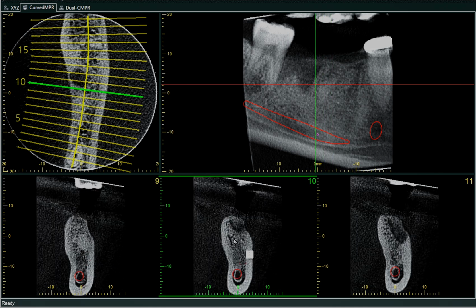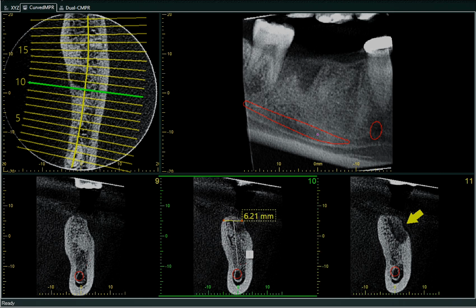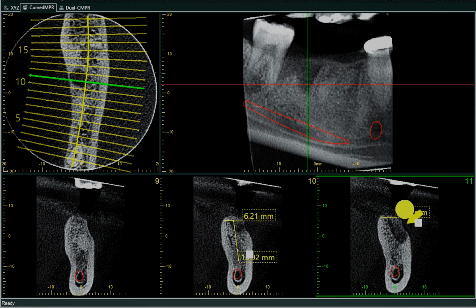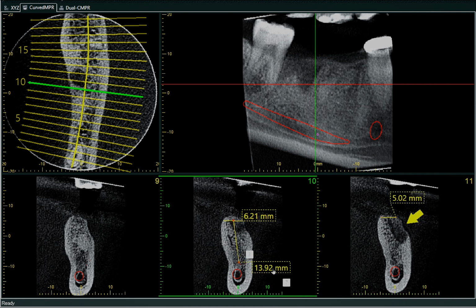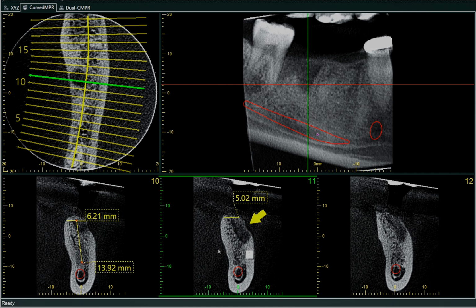They have to take care of the drilling. Also, this is the 4-7 region, so here also one has to be very careful while placing the implants, as the buccal cortical plate is at a lower level and quite thinned out compared to the lingual cortical plate. You can do the marking over here, and this is around 5 mm, or 5.5 mm. Based on the presence of cortical plate, you can give an approximate marking, and it is quite far away from the nerve canal. Ideally it should be 5 mm, and 9 mm should be the ideal height, but it is greater than that, so it's good enough. One has to also be careful of the lingual undercut area, but in this case it's a shallow lingual undercut, so there's nothing to worry about.